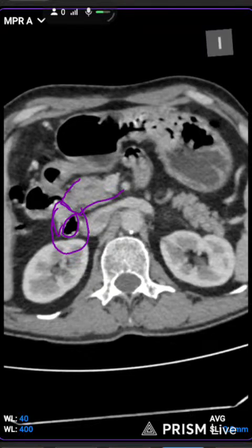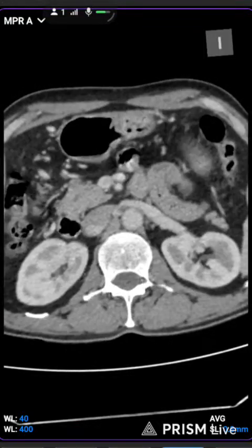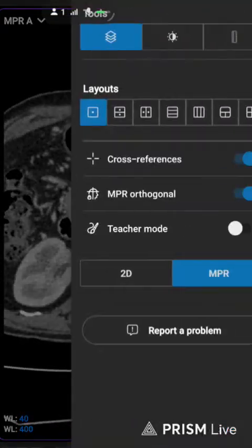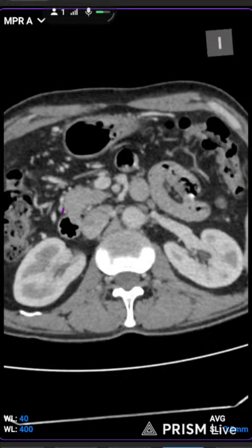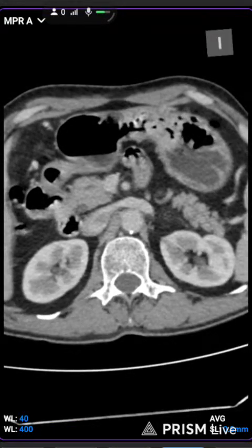just because the duodenum was compressed by the pancreas. So this is the diagnosis of this patient. Normally, as you can see in this slide, the pancreas connects to the duodenum in this type of area, but here we can scroll the image. Here you can see the pancreas compressed the duodenum in this area.